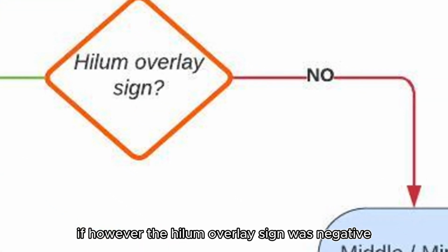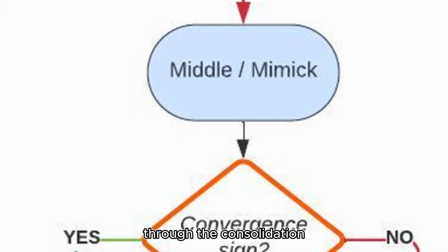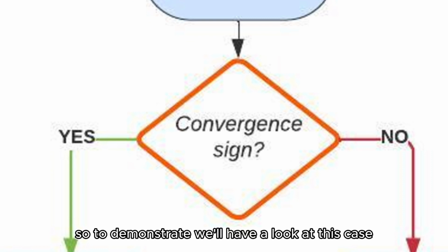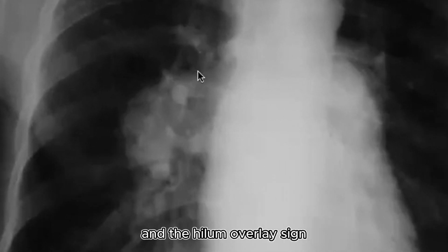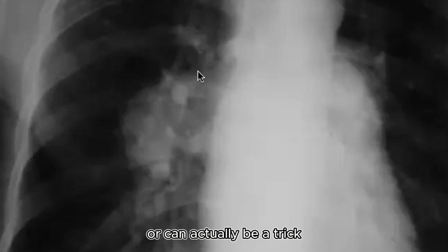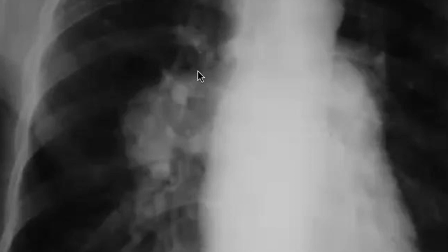If, however, the hilum overlay sign was negative, which means that we cannot see the hilar vessels through the consolidation, we next check for the convergence sign. So to demonstrate, we'll have a look at this case. Here we have a mass or consolidation, and the hilum overlay sign, we can't really tell the vessels apart. So this consolidation must be either next to them, or it can actually be a trick, and this might actually be the pulmonary vessels themselves. The convergence sign can help us figure that out.